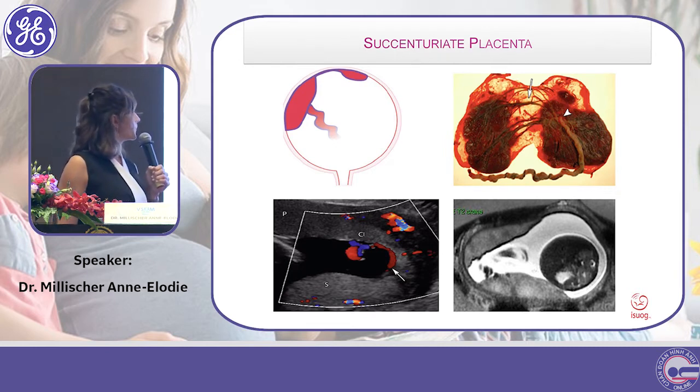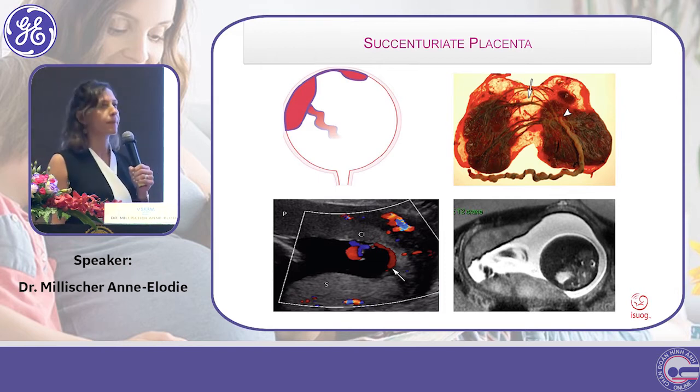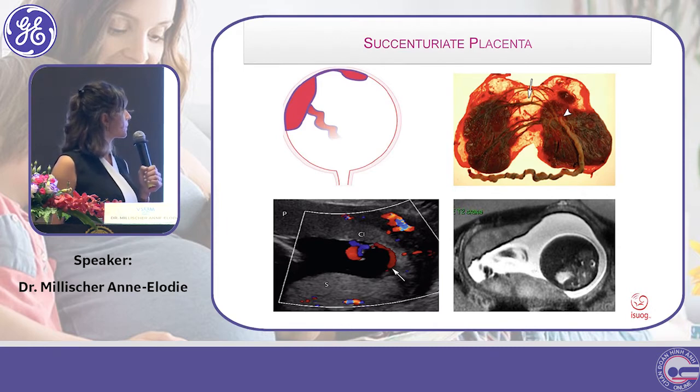Trong cái bánh nhau phụ này mình sẽ thấy bánh nhau nó có hai thùy, một thùy lớn và một thùy nhỏ, và cái mạch máu nó sẽ chạy ngang qua cái giao diện giữa hai cái thùy này.